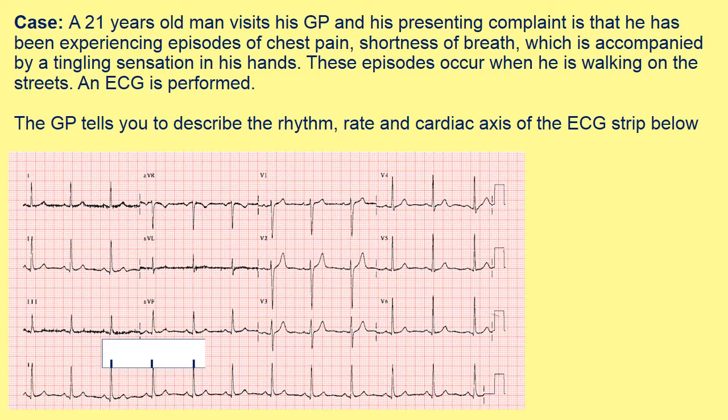So what type of rhythm is this? Is it sinus? Is it atrial? Is it ventricular rhythm? Or is it junctional rhythm? So first of all, let's see if it's supraventricular or ventricular rhythm. The QRS complex is normal, less than 3 small squares, so it has to be a supraventricular rhythm. And if you look at the P wave, there's a presence of normal P waves. So we say that sinus P wave is present and the QRS is normal. That will be a sinus rhythm. Watch my previous video, which gives a longer explanation of how to understand and remember types of rhythm.